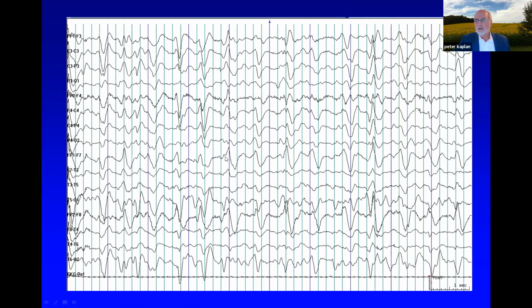Now, if you look at the morphology, this is the triphasic wave that I was showing you earlier. Antero-posterior lag. This is the time base, so it occurs earlier here and a little bit later here. Now, they're not all morphologically similar like clones. Like this one has this phase reversal, which is a bit unusual. But typically, you have a very minor first phase of the so-called triphasic waves, a big second wave, and a big third wave. And mostly with the typical triphasics, they are not anterior, they're frontocentral.